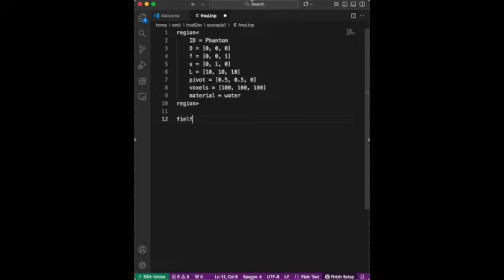So to define my beam, first I have to give it an ID, which is field ID 1, and there has to be an origin of this field beam. As I was thinking, this field beam is not a single source from which the beam will emerge.